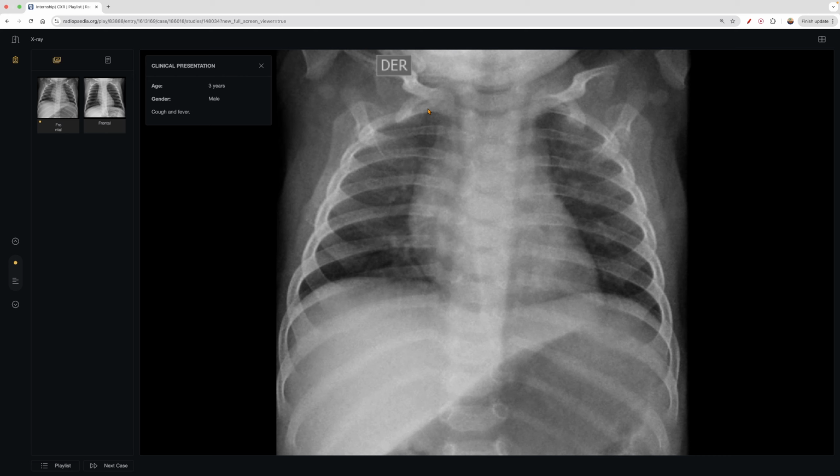For inspiratory effort, the way we want to assess this is you can count the posterior ribs. So we have the first rib here, second, third, and then you can come across. When I say posterior, it's counting from 1, 2, 3, counting back here, versus anterior would be coming all the way around and counting these guys here. You can see kind of where it ends, and you can see it gets a little challenging. So I always liked posterior for myself.